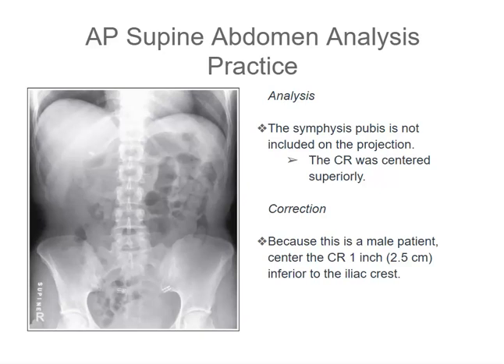From my experience, I can tell that there are no air fluid levels, but there is air within the abdomen and some fecal material.